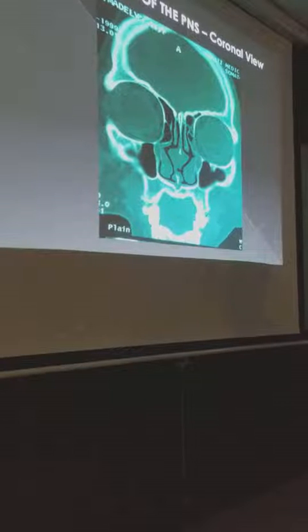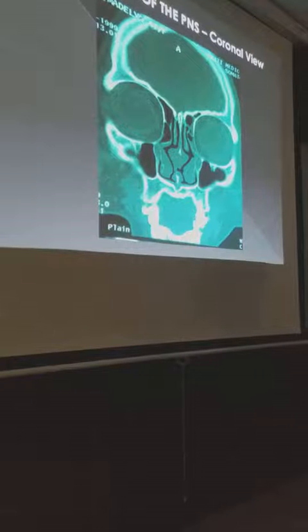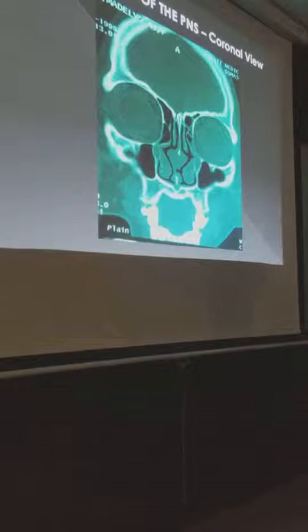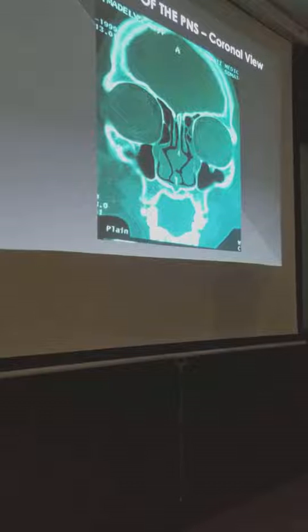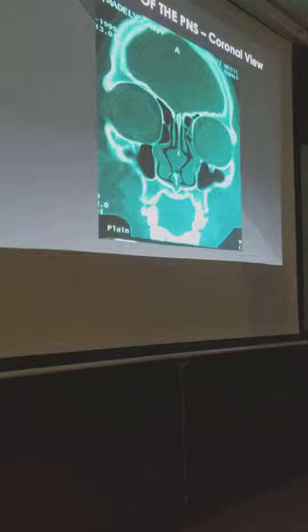So remember, the problem with a variable slice thickness like this is it's very difficult for you to understand where the agger nasi ends and which is the next ethmoidal cell that you're looking for. Bula. Understand? The problem is that you don't know when the agger nasi ends and when the anterior ethmoidal bulla begins because malaki yung jump. But by knowing the relations, madali mong malalaman. Diba? Okay? So, that's your inferior turbinate.